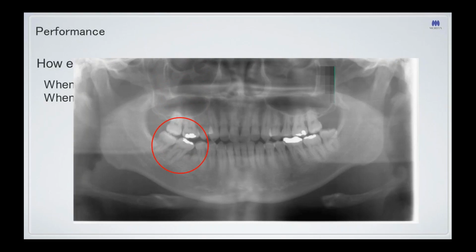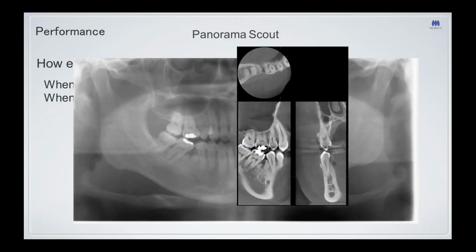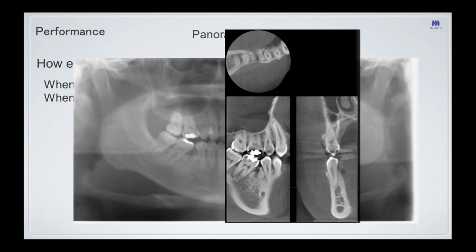So if you're already taking a panoramic image with your cone beam, and most of them do have this functionality, you could actually, in some cases, select on the panorama a small field of view. Say, for example, if we wanted to focus in here and scan, we could get our CT directly off the pan. Again, this just makes it easier for your staff to use.